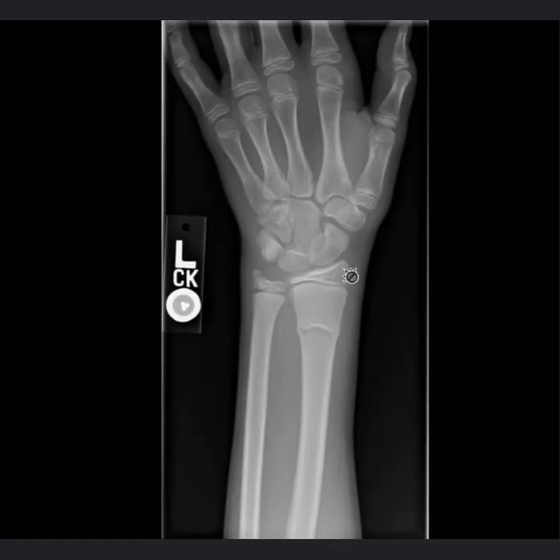So this is another gentleman that I saw, a 13-year-old patient who was playing hockey. He collided with someone and immediately had pain within his wrist area. These are the initial x-rays upon presentation. You can see he has, again, this metaphyseal distal radius fracture with these cortical bucklings noted on the AP view. A little bit of an ulnar styloid fracture noted there as well.